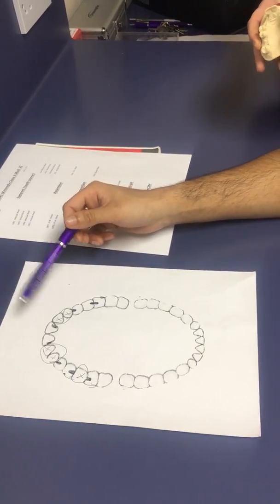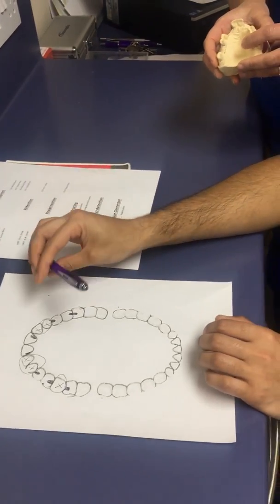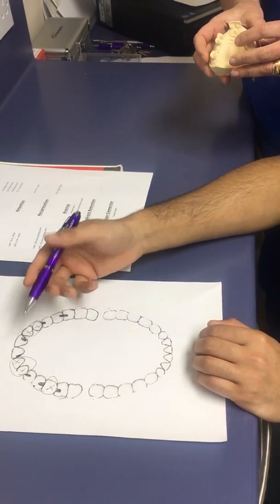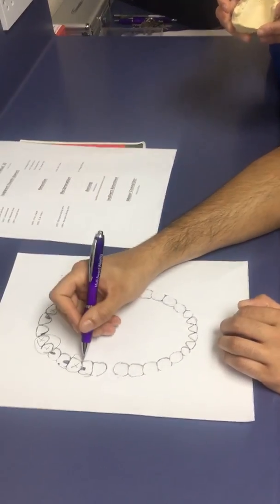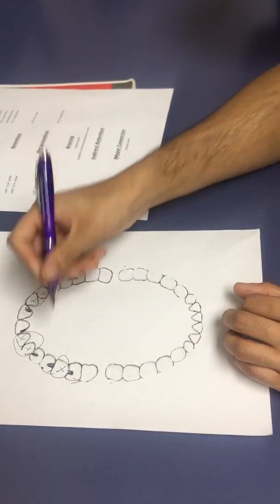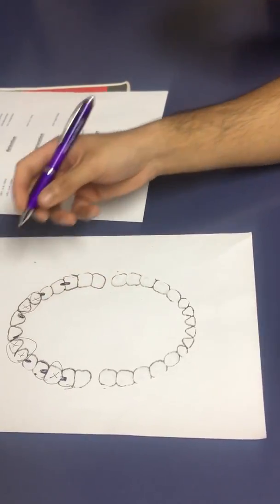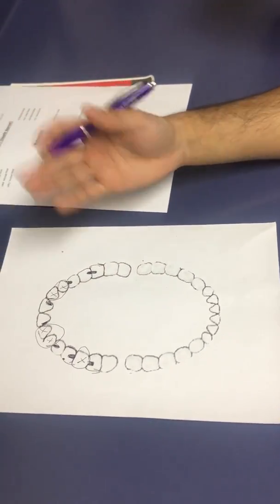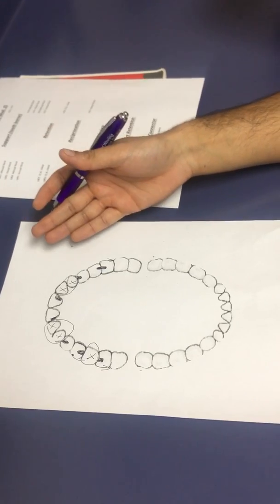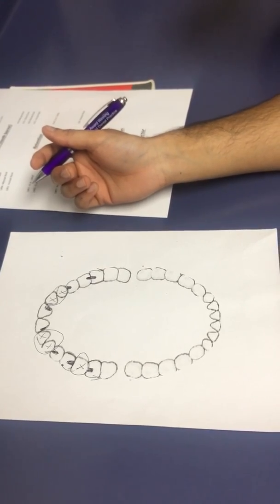So with retention and clasps, you always need reciprocation to prevent damage to the tooth in terms of function during horizontal movement. On the clasp arms, you need a reciprocating arm. And all of them here. You could put a plate, but it's larger than a reciprocating arm. Yeah, it makes it more likely to get plaque and therefore periodontal disease. So you're covering too much tooth, so it's better to just put an arm.